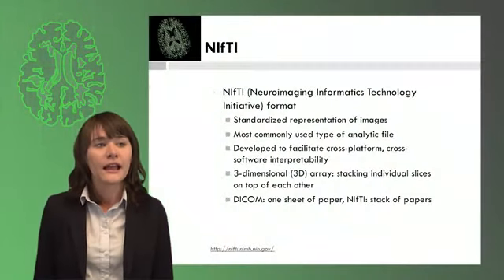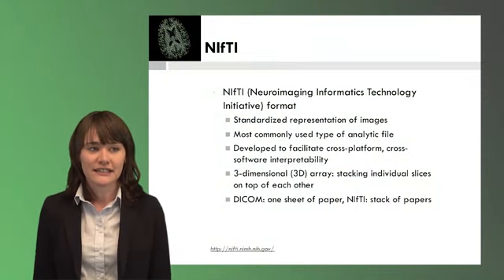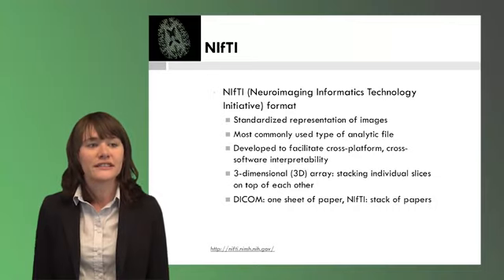Alright, now that we've gone through the DICOM imaging format, we're ready to start with the NIfTI imaging format, which is a way to look at objects as 3D images in R and with other neuroimaging software. NIfTI stands for Neuroimaging Informatics Technology Initiative. It's a standard representation of images, and it's the most commonly used type of analytic file.